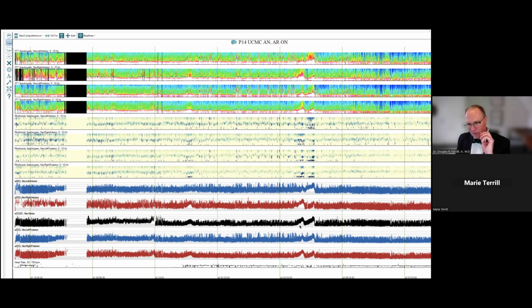And you can see that this elevation is characteristic of neonatal seizures. What's nice about this one, it's separated, it's pretty clean. And you can see that it was clearly right-sided, but it extended to the vertex in this patient. But then later on, you can see it goes to the left. And you can appreciate the same thing on the spectrogram.